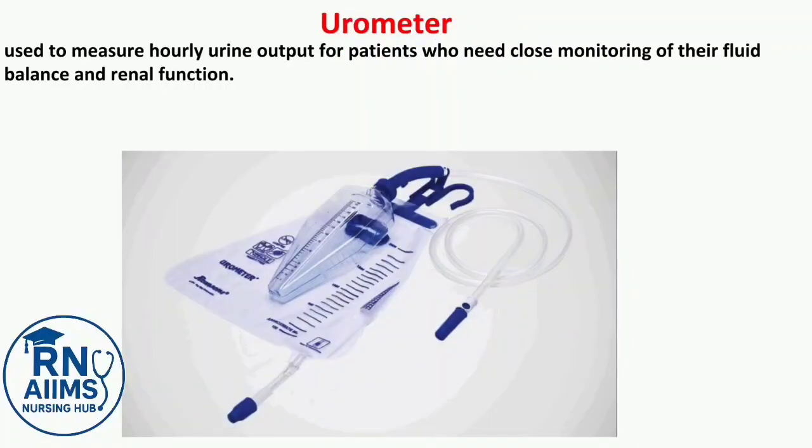Urometer used to measure hourly urine output for patients who need close monitoring of their fluid balance and renal function.